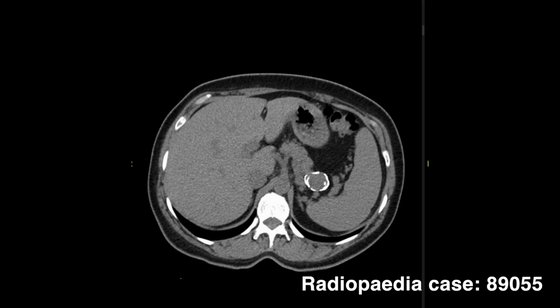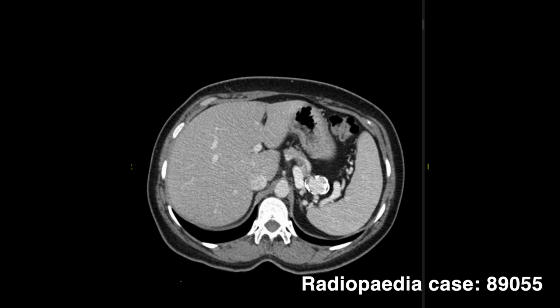If you look at the arterial phase, you can clearly see it. This is a pseudoaneurysm of the splenic artery. Elastase from the necrosis has digested the vessel wall. It's being held together by clot and fibrin. It will rupture. It's a matter of when. If you see something like this, you pick up your phone and call the interventional radiologist team. You need the embolization at that moment because this could save the patient's life.